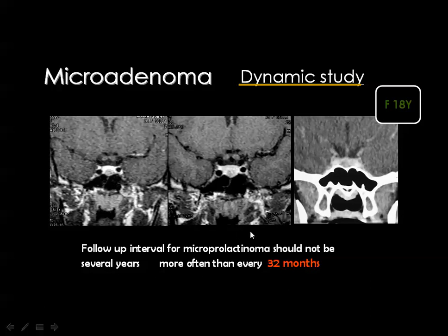And sometimes the microadenoma does not cause a pituitary surface bulge, because the microadenoma is actually located near the sellar floor, and depression of the sellar floor was sometimes considered a sign of pituitary microadenoma whenever you see homogeneous enhancement of the pituitary gland, which may be related to the site of the pituitary microadenoma.